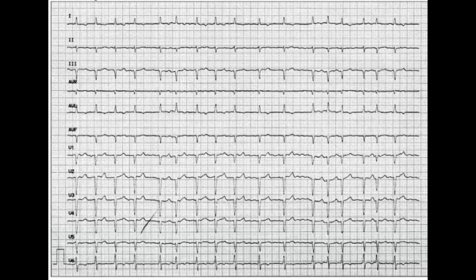You'll learn that there are many more, but for now, in the booklet, there are these two, atrial fibrillation and atrial flutter. If you're not here, you can see some P waves, and you can calculate the distance between them and find the frequency of the P waves. One thing that always helps to know is that atrial fibrillation will always present with irregular action. So if you see the QRS, first of all, you don't see P waves. You suspect a non-sinus rhythm. It's high heart rate, like tachycardia. And you see that the action is irregular, suspect atrial fibrillation.